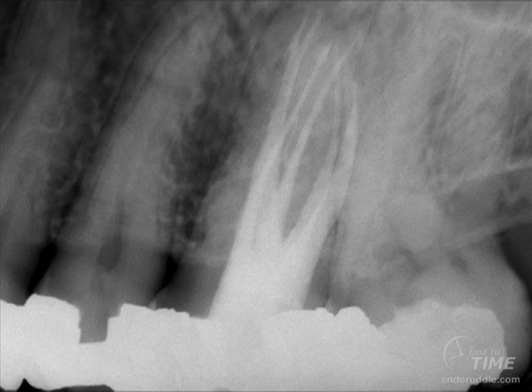And here we have a maxillary left first molar. There's a palatal 1 and 2. There's a mesial buccal 1 and 2. Notice the long anastomosing between the MB1 and 2. And then there's a DB1 and 2 again. So this maxillary molar has 6 systems.